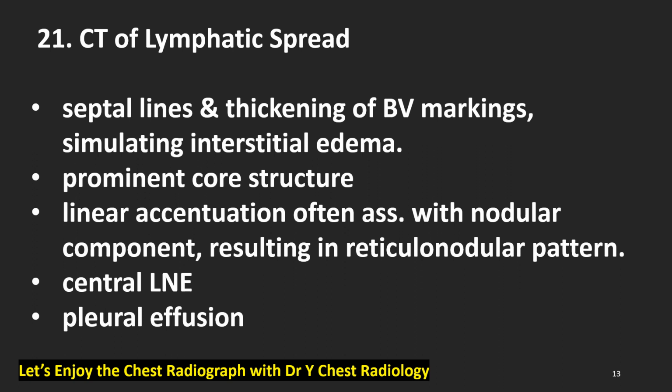CT scan findings of lymphatic spread: septal lines and thickening of bronchovascular markings simulating interstitial edema, prominent core structures, linear accentuation often associated with nodular component resulting in reticular nodular pattern, central lymph node enlargement, central such as hilar or mediastinal, and pleural effusion.